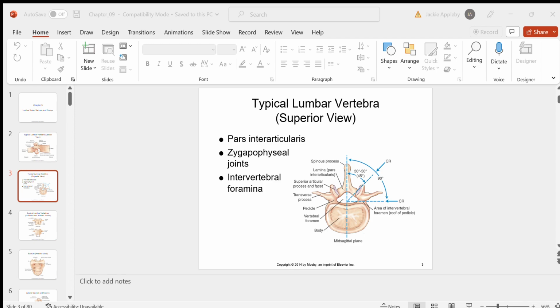Let's remind back to the cervical spine. In the cervical spine, in what position do you see the zygapophyseal joints? AP, oblique, or lateral? It is the lateral projection. So the lateral projection of the cervical spine shows you zygapophyseal joints. An oblique projection of about 60 to 70 degrees in the thoracic spine shows you those same joints.